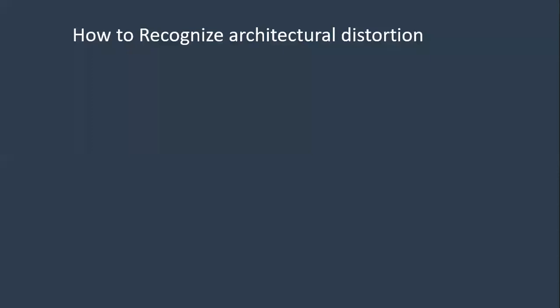The definition of architectural distortion: when the breast surgeon comes to you and asks why you reported this as an architectural distortion, you will tell him, I could see here a contour deformity with angulation or with feathering or with retraction, along this area of long spicules radiating to this area, and there is also associated so and so.